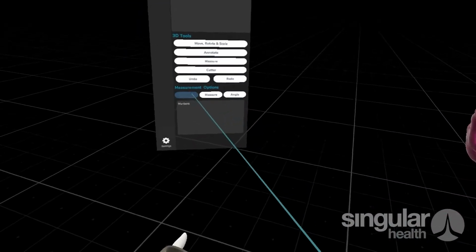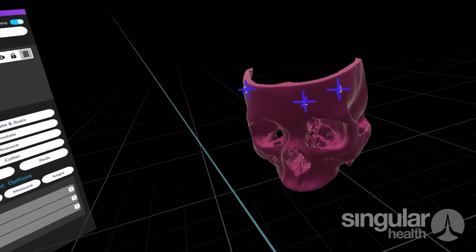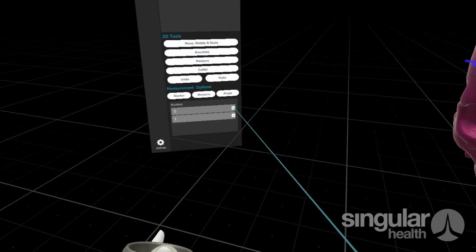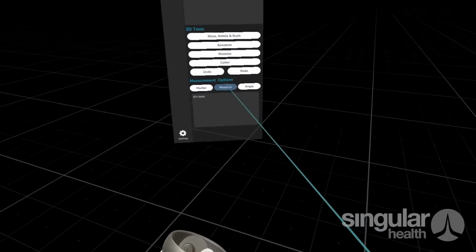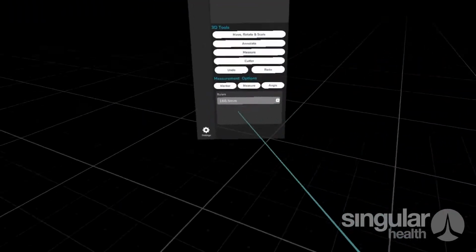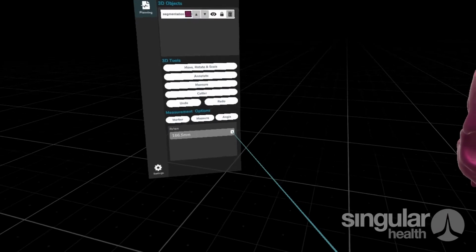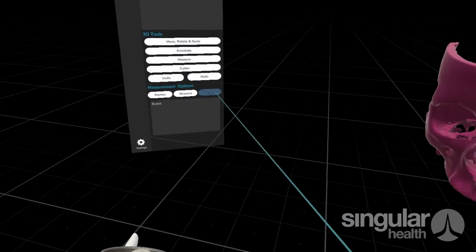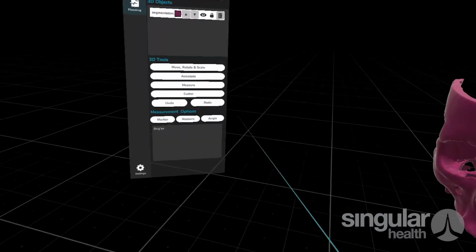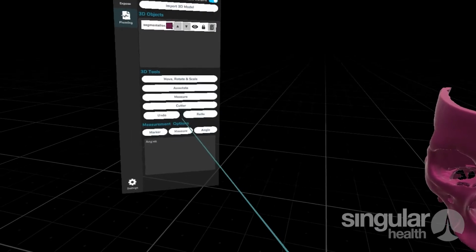Next up we'll go for the measurements. So simple, very similar tools before. You have all the marker tools letting you mark up the mesh, and then everything's represented at the same time. We'll go to measure, so it lets you draw measurements. On here it will display the measurement on there. I actually think the measurements just combine the mesh. And then obviously you can do angles as well. Everything can also be undone and redone at the same time using these two buttons down here.